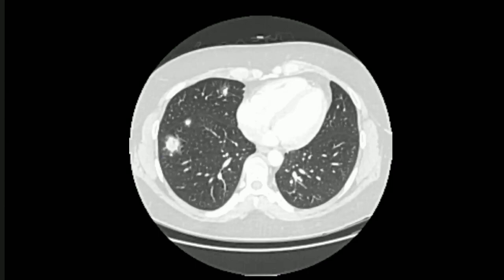Yes. So does it change your differential? It's a very good differential. Fungal infection mostly would be in the differentials, but it's mostly in the mid to lower lobe. And the patient is otherwise well. He has a history of hemoptysis and there's no fever. The CRP is slightly raised. What do you think about serological findings? Do you want to do any test? Sir, I want to do ANCA antibodies for Wegener's.